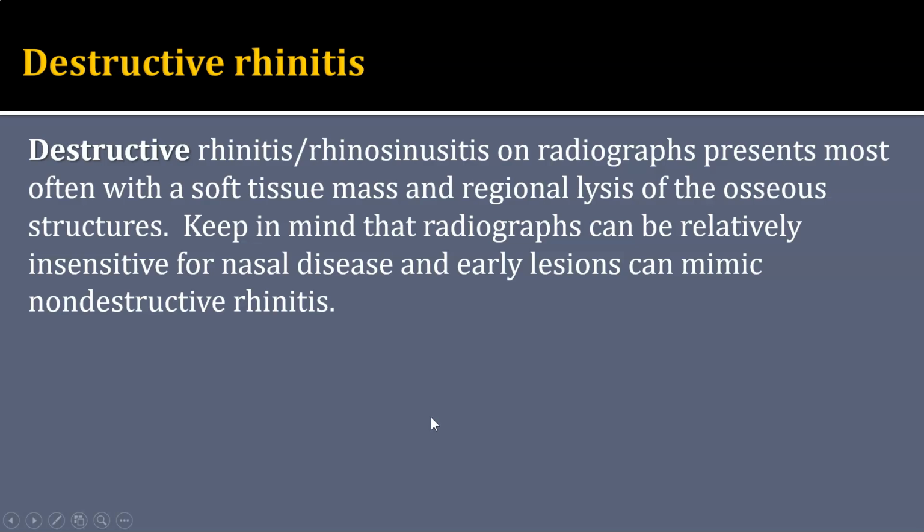So now let's discuss destructive rhinitis. Destructive rhinitis or rhinosinusitis on radiographs is going to present most often with a soft tissue mass and regional lysis of the osseous structures. We do want to keep in mind, though, that radiographs can be relatively insensitive for nasal disease.